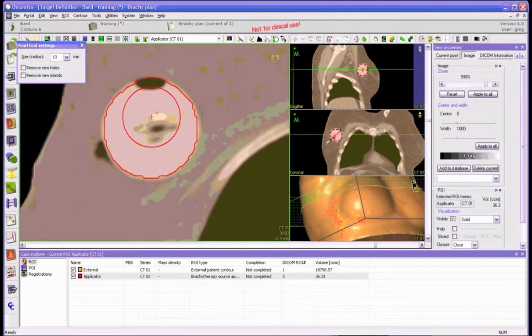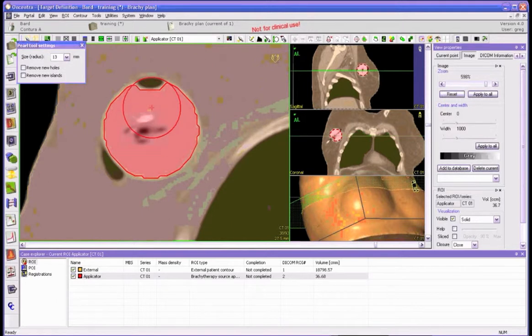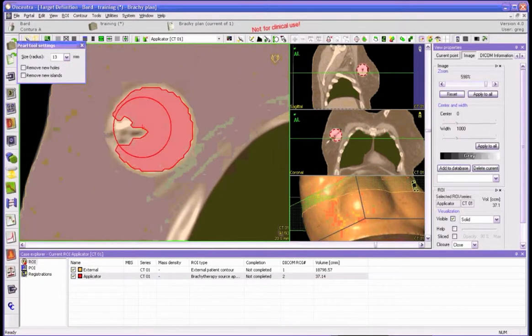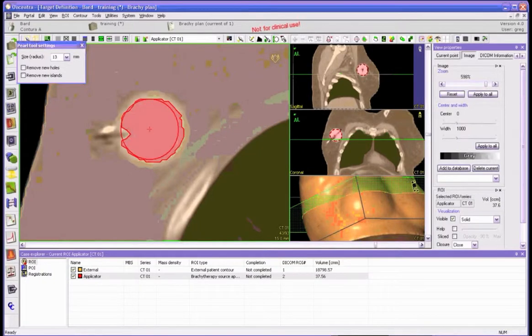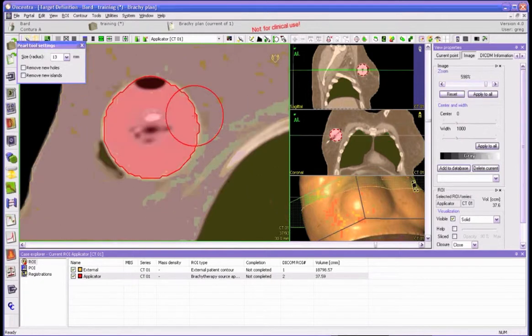And we'll go back the other way, get the bubble, maybe a little bit of bubble there, and then there's some of this low density stuff. Oops, I was inside the low density region. What you can do to alter that is to hold down the Shift key if you do that, and that'll change its behavior to add instead of subtract. Okay, I'll clean that up just a hair, and that looks just about right.